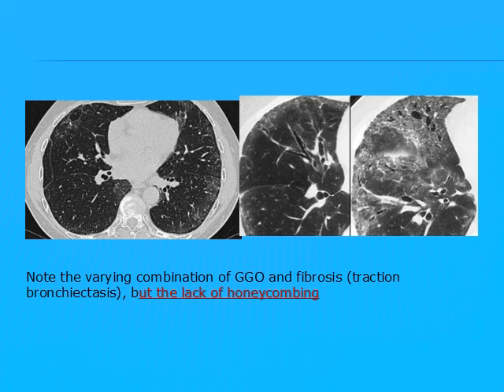This is what we want to say. You see ground glass opacity here with traction bronchiectasis. Okay, you can see some reticular pattern with ground glass opacities, and as you see, there is some sort of subpleural thin rim of sparing of normal lung. But in all these cases, we don't see honeycombing. Again, rim of ground glass, concentric, subpleural, with some sparing of the thin rim subpleural area.